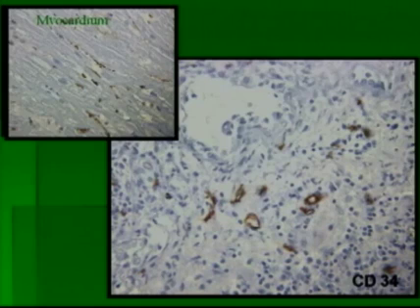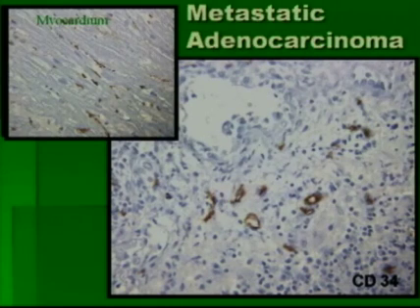If we look at the pathologic specimen of the mass that's outside the heart and compare it to the myocardium, which is the small box up in the upper left-hand corner, we can see when we stain for CD34 that there are these brown circles here, and in fact when we perform quantitative analysis on the pathologic specimen there is higher vascularity. And this was consistent with a metastatic adenocarcinoma as diagnosed on pathology. We do not have a comparable assessment of the intracardiac mass because, let's face it, it's pretty clearly a thrombus, and this patient went to hospice.